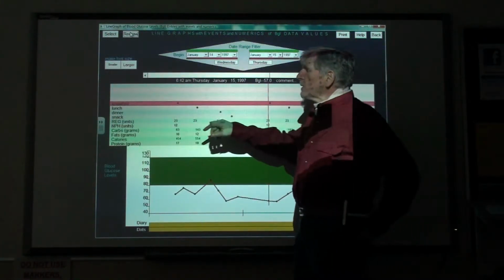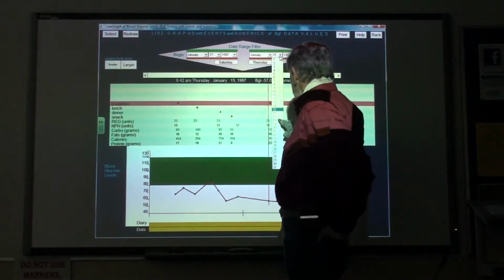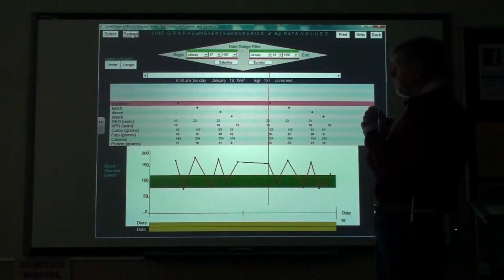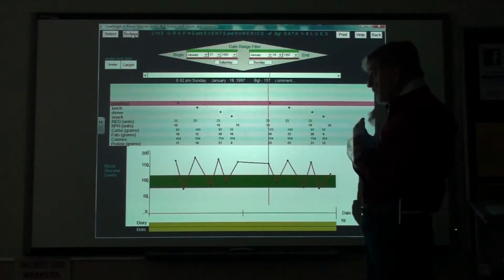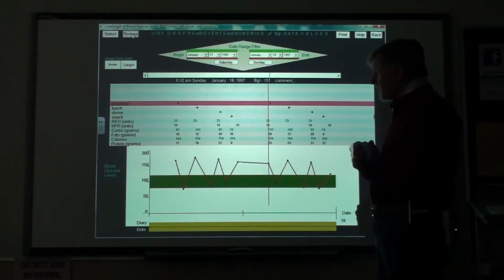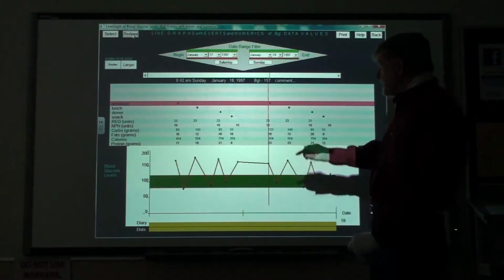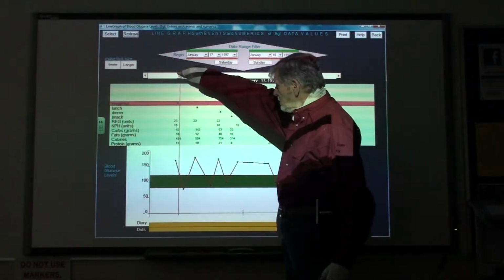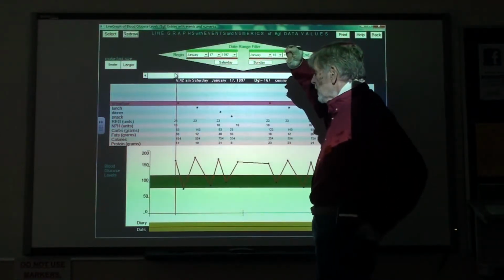So the third data will be on 17 and 18. See if we can decipher from this graph, analyzing the insulin that's injected and the food that is ingested throughout the day with the readings, and to see what kind of adjustment that we should make. What is happening is at fasting, the reading was a little bit high.